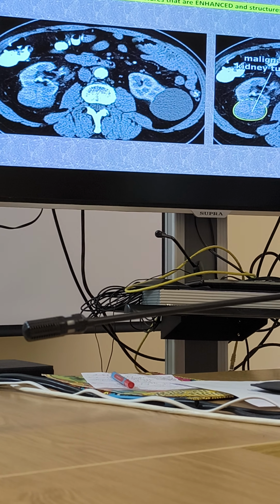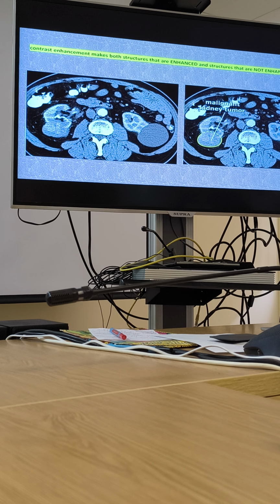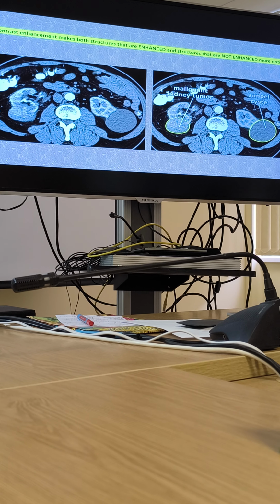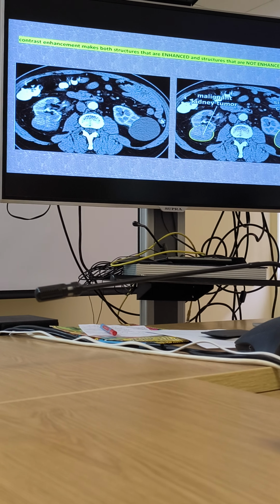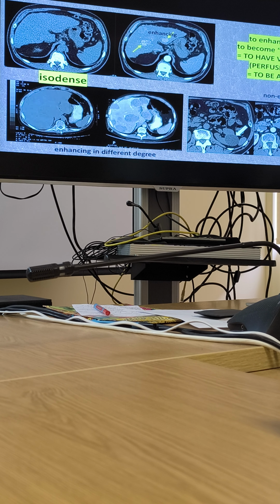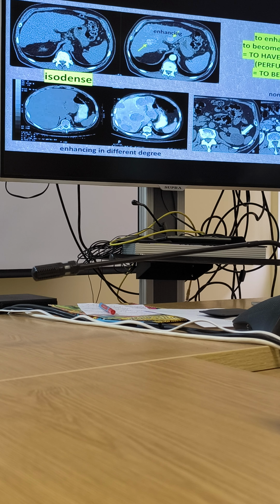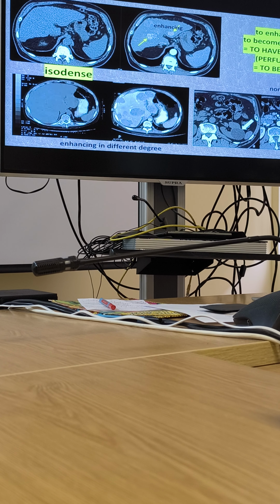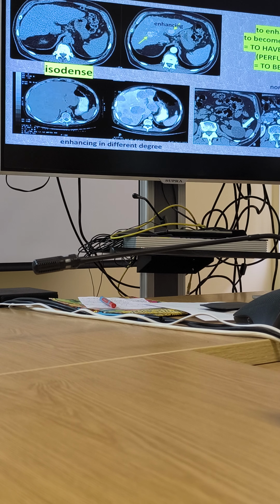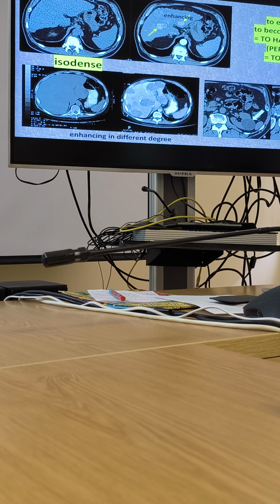When something is enhancing and something is non-enhancing, we are just looking for a difference between norm and pathology, yeah? Between the tissue which they derived from and the disease. So both are good, yeah? And another helpful thing is that by looking at the pattern, at the way of enhancing or non-enhancing, we can think about diseases and make guesses what the disease is, yeah?